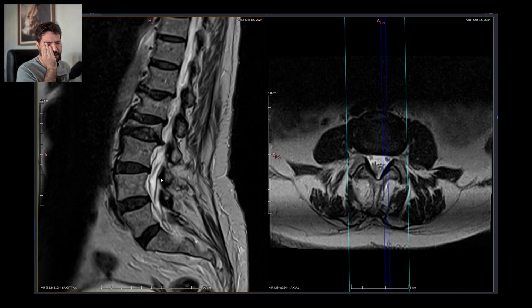These are classic cases of lumbar spine fractures, pathological fractures due to bone insufficiency. It gets so frail that it eventually breaks under minor stress. So this is it. We are done here. Let's just go and move on.